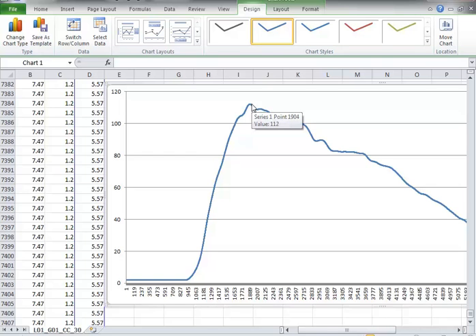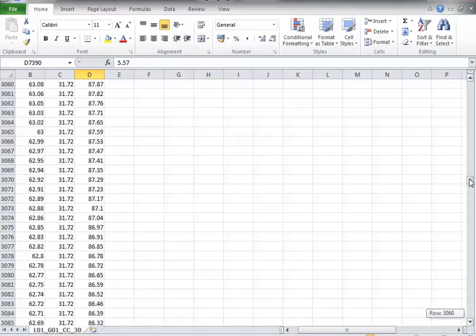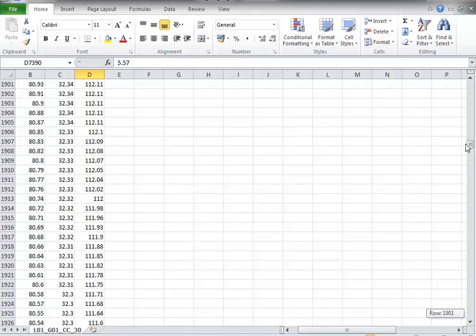But if you look at it, by doing it this way, if I move my cursor slightly to the right, you can get slightly different values. So you either need to make the graph incredibly big at times or rely on another method for doing this. So it gives us a really good idea of the data. You can check this value against previous literature and see if it's a suitable maximum. But for getting accurate values, we're better off looking at the actual raw data.